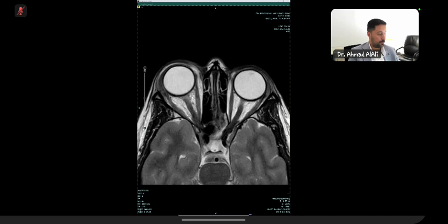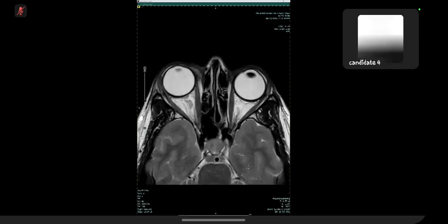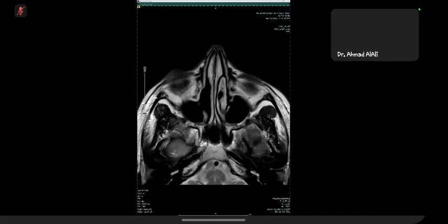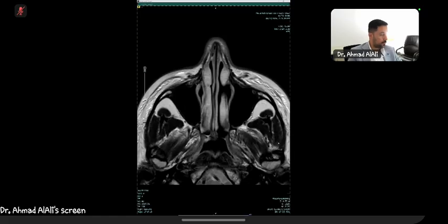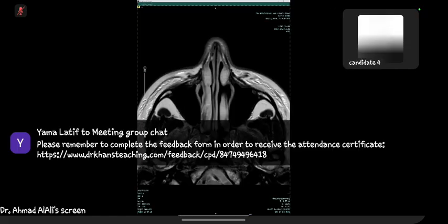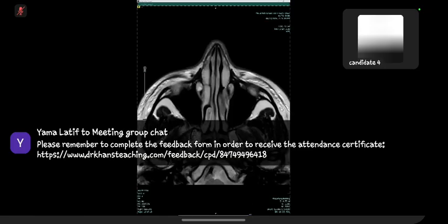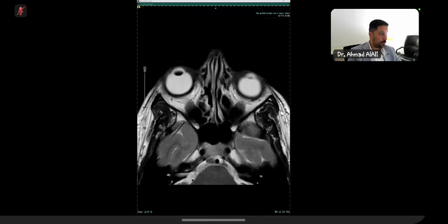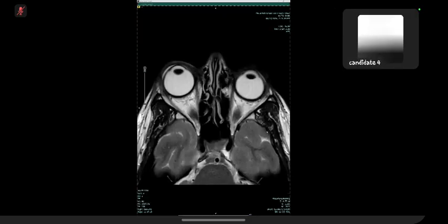Okay. So I've been provided with the focused field of view MRI orbits in the T2-weighted sequence. These are not fat suppressed. As I'm scrolling through the images, I'm first focusing on the cavernous sinuses.